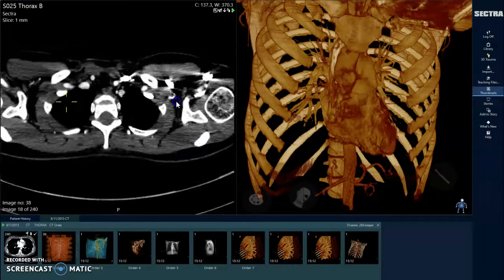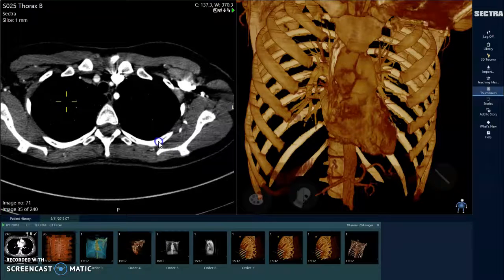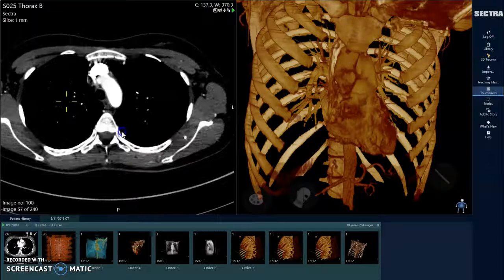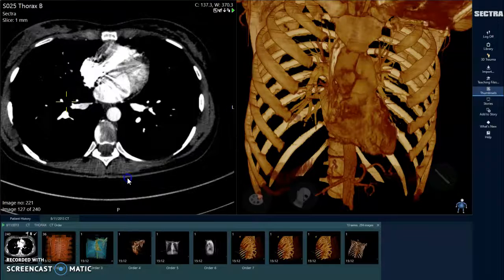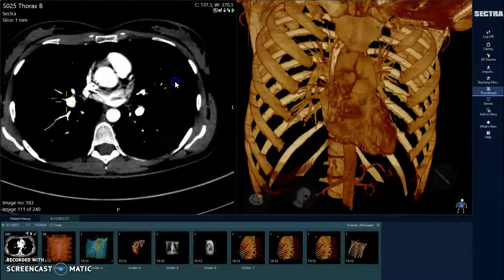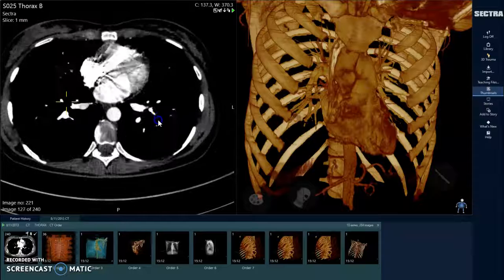So we've got aortic arch there, pulmonary trunk there, into the main chambers. You can see left and right ventricles. I'm guessing this contrast hasn't had time to go right around, so it hasn't got back into the venous system maybe.